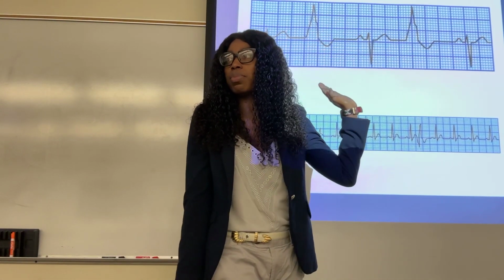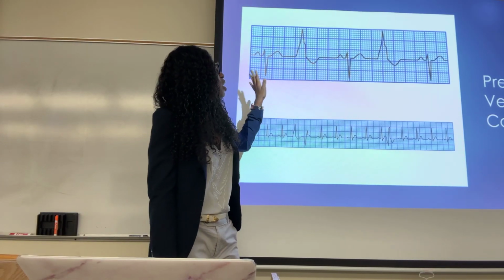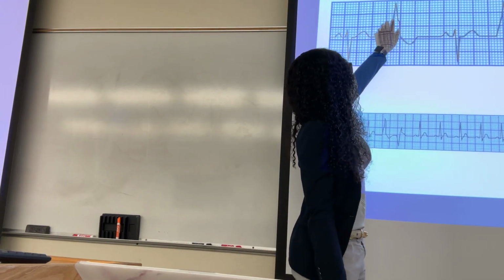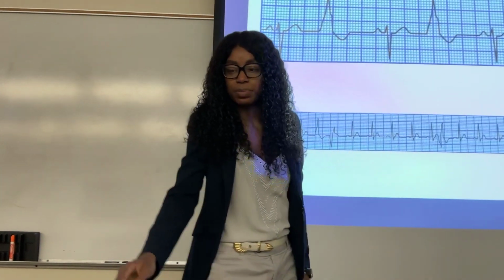And there's a big problem with the bigeminy, trigeminy, or what we call the run, is that eventually, if they continue, they can cause VTAC. Because you'll see VTAC looks just like this, right? But all of it looks like that, okay?